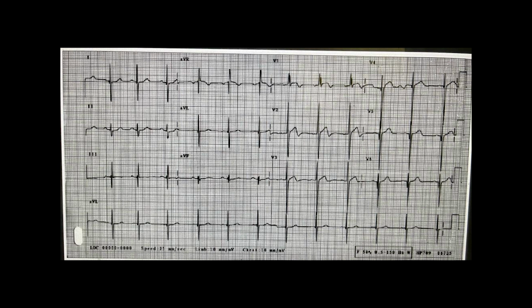Indeterminate QRS axis is when the QRS complex is equiphasic in all limb leads and the QRS axis cannot be truly determined. This situation is most commonly encountered when the QRS voltage in all limb leads is very low, as seen in severe hypothyroidism, cardiac tamponade and constrictive pericarditis. Thank you.